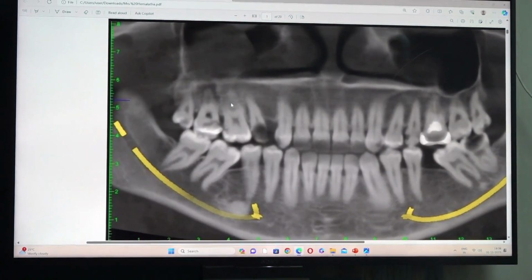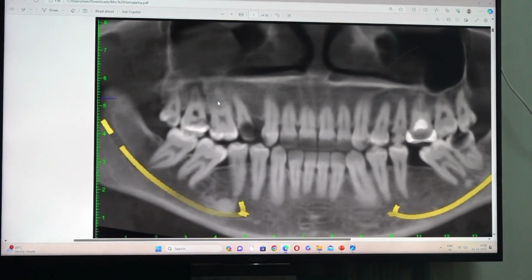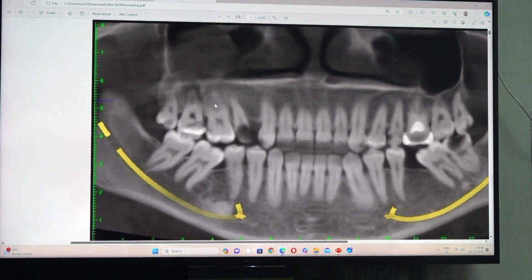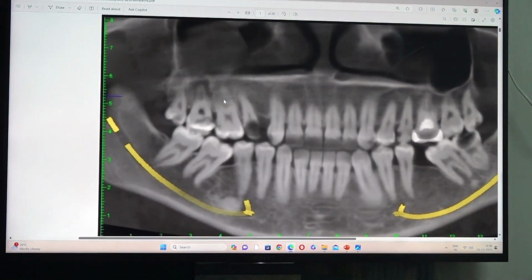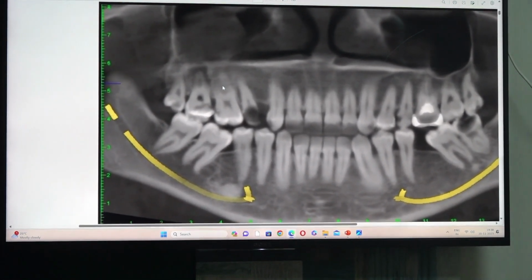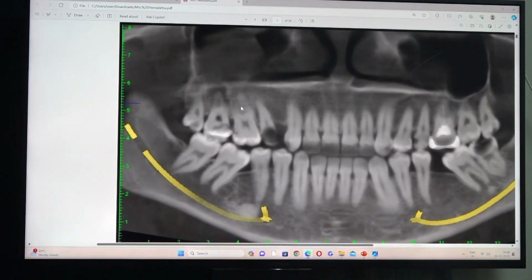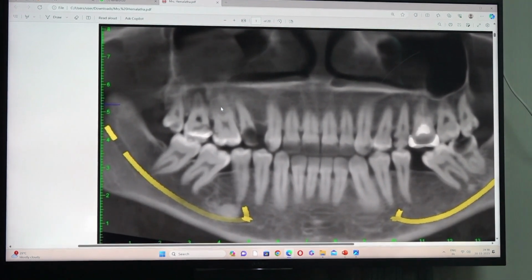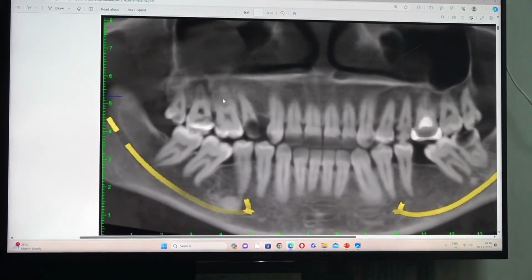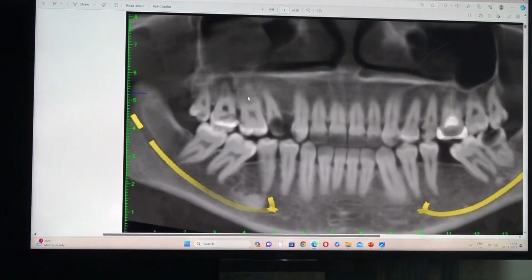the sinus floor. As you go, you will feel a small resistance, not very heavy, similar to the nasal floor. The resistance will be very little. If you are not careful, you may miss it. Mostly it will be around 10 or 11.5, or 13, something like that. You will see the buccolingual cross section later. We are just planning with the panorama. So 3.75 into some length where the drop occurs.